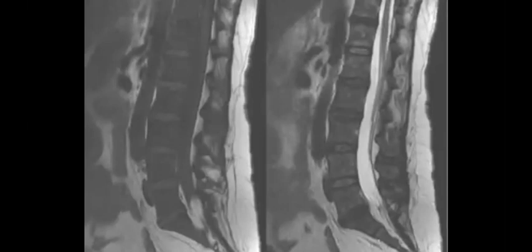Perfect. So we need a STIR. Oh yes. Fat suppression. Yeah. Extramedullary hematopoiesis. Yeah. Then it's good to mention now that maybe mastocytosis and myelofibrosis will be one of the good differentials. Then again, you will search for the splenomegaly.